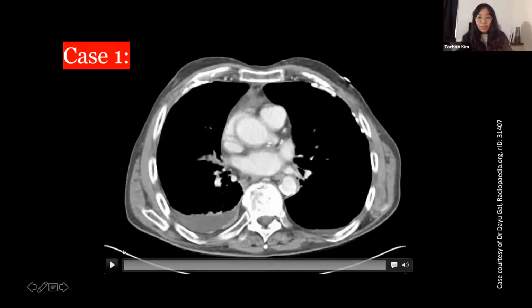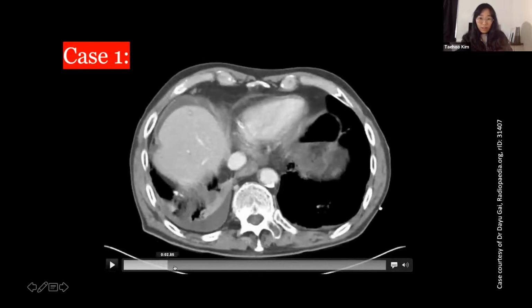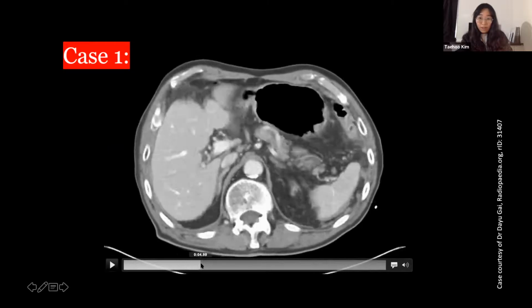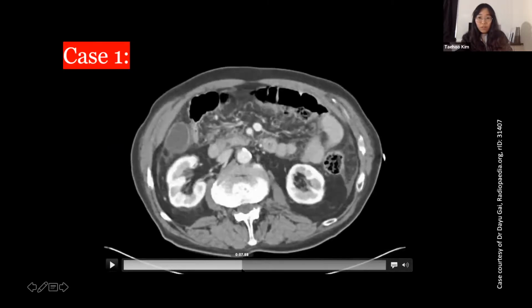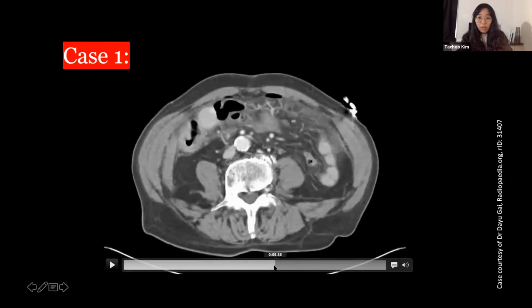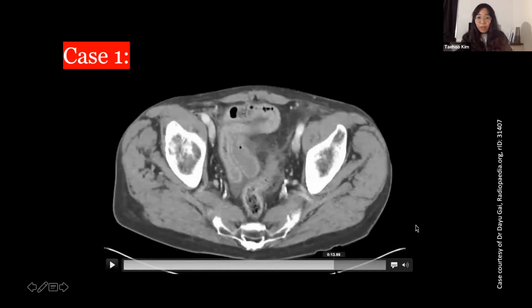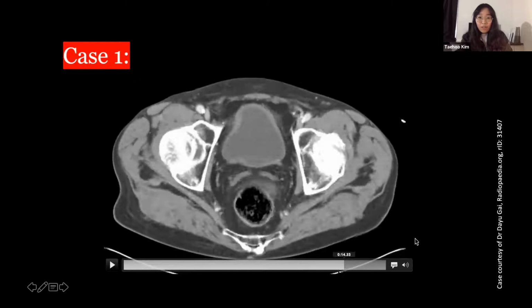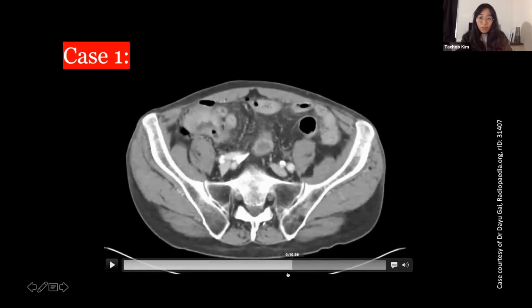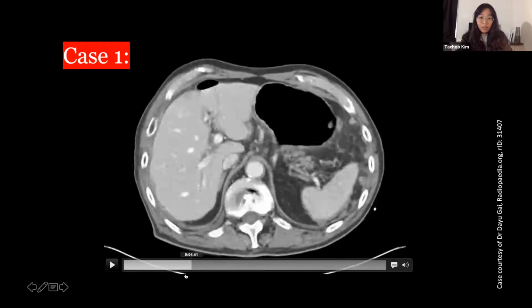Ignore the pleural effusion here. I'll show you this. It's just like getting your first impression. You have to see what pops up, what looks the most abnormal here. I know that everything looks a bit dirty, strandy, but if you're scrolling once and there's something that caught your eye, that's really good. So for this case, I'll just guide you.